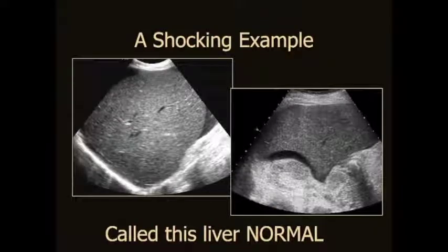So this is my most shocking example ever, and I've had this for a long time. Some of you will have seen it before, and the reason I still use this same case is because this is the best case ever, and I don't see this every day. This is infrequent, but I show it to you for impact. So this patient came to our emergency department with abdominal pain, and one of my colleagues called this liver normal on ultrasound.